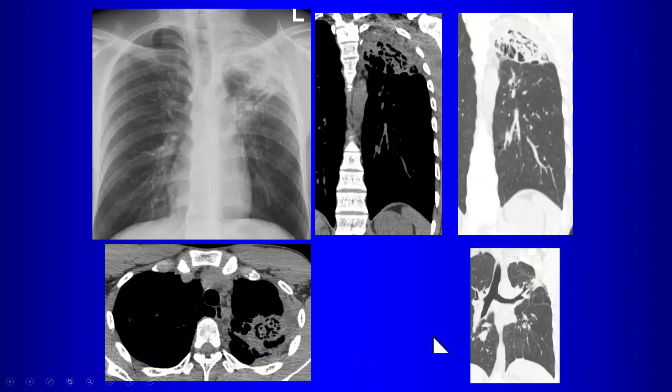The topic of this point of the lecture is, yeah. So in this case, this was semi-invasive aspergillosis, right? This was chronic aspergillosis infection. So semi-invasive aspergillosis can also look like tuberculosis.